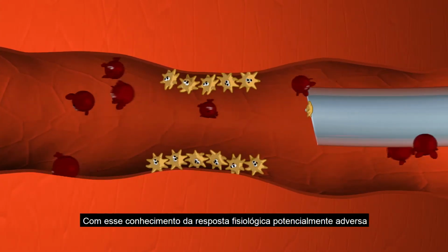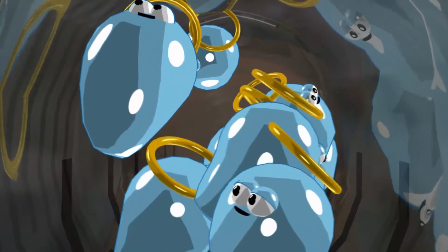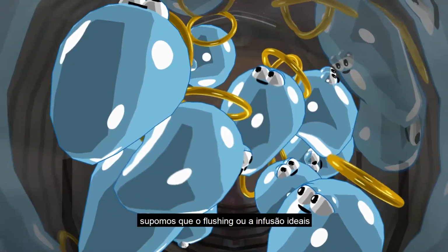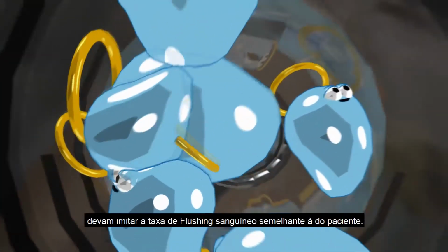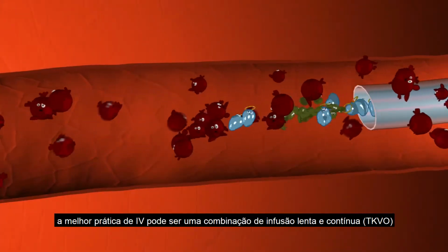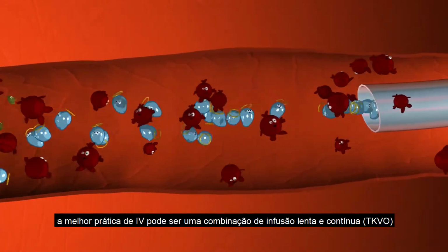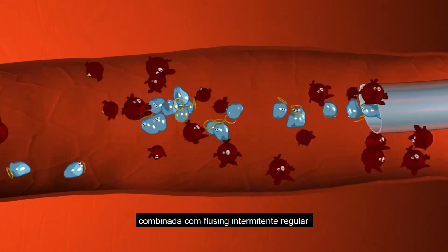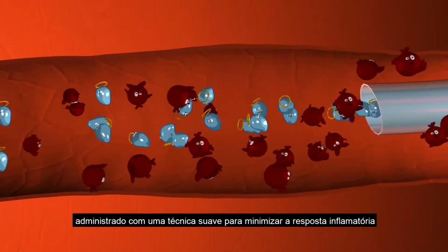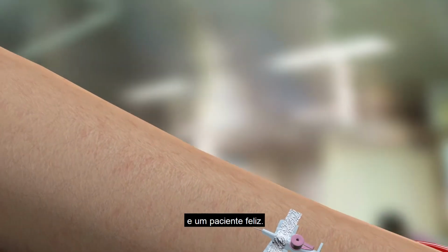With this knowledge of the potentially adverse physiological response to high-pressure flushing or infusion, we hypothesize that the optimal flushing or infusion should mimic the rate of blood flow similar to that of the patient. To minimize stasis and platelet activation, best IV maintenance practice may be a combination of slow, continuous infusion combined with regular intermittent flushing delivered with a gentle technique to minimize the inflammatory response. And this means a happy vein, a happy IV catheter, and a happy patient.